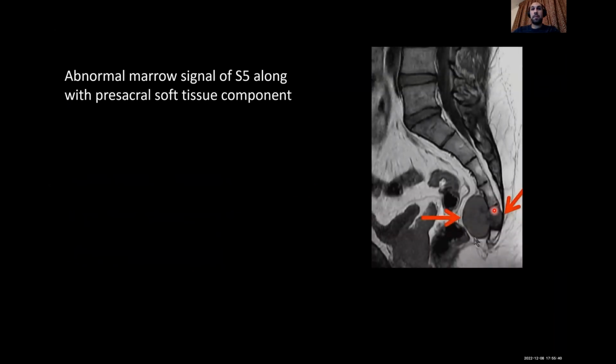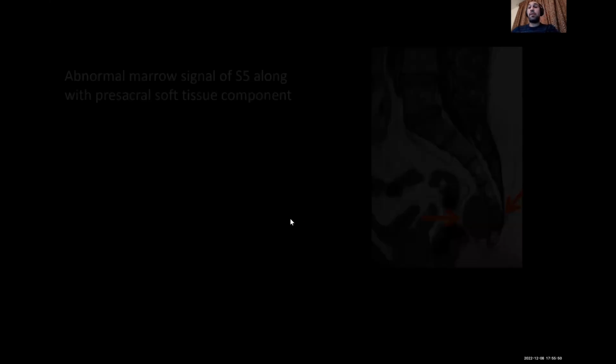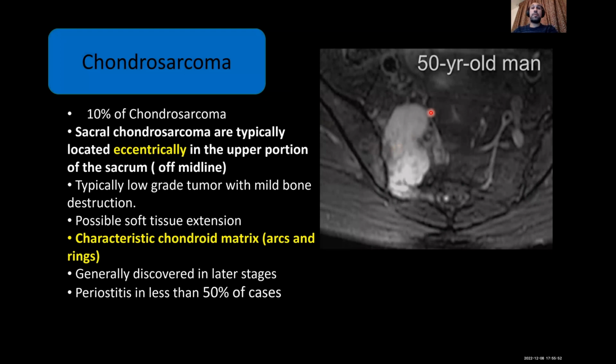When you find a lesion like that, this is chordoma until proved otherwise. But in this case, this is not the same tumor, the same lesion which I showed you above.